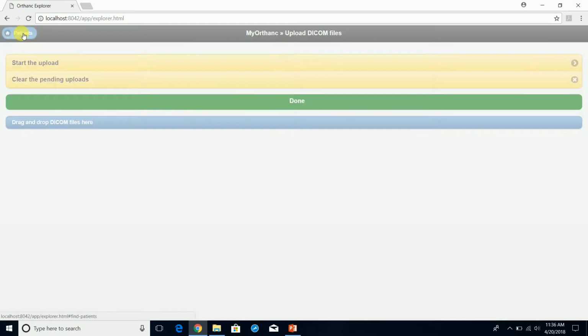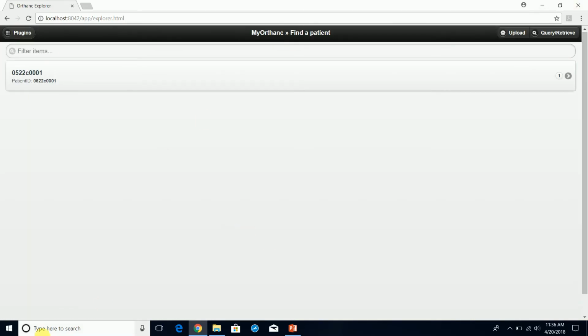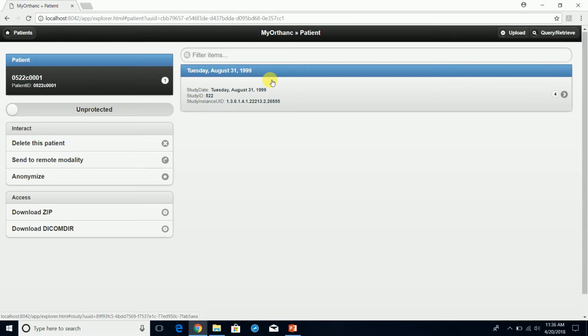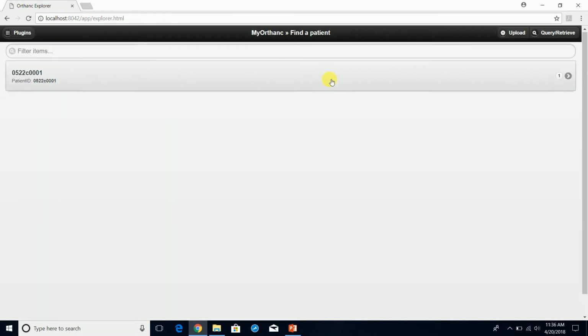Okay. Now we go back to patients. So now we have our patient in the list here. This is the actual patient name because these studies are anonymized. So the patient name is also the same as the patient ID. So we have one study. So it should be one study. Or let's see, yes. So let's go back there. Just wanted to verify. So this one correlates to one study for this patient.